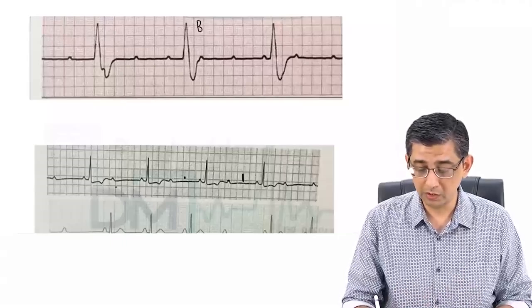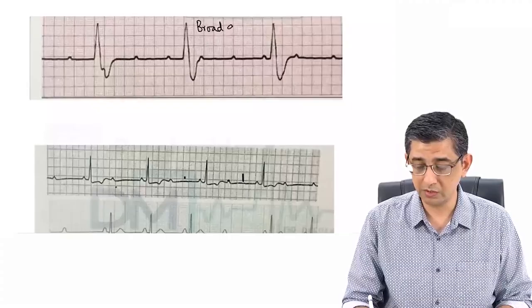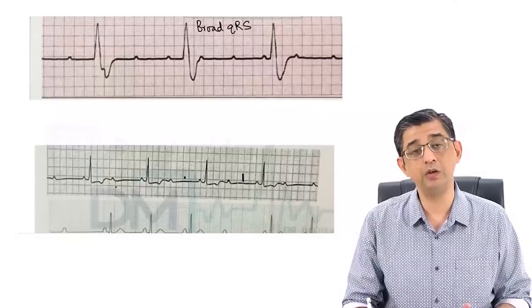The moment you notice these broad QRS complexes, you need to ask yourself, is this a tachyarrhythmia or a bradyarrhythmia?